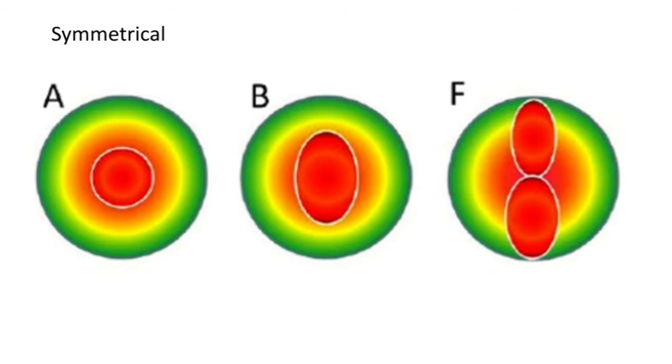So, when can you call this shape normal, and when does it become abnormal? By looking at the Kmax value. Suppose the Kmax value is more than 50 and it shows a normal round shape in the central area, it indicates there is a chance of keratoconus. Or if a symmetric bow tie is there but the Kmax value is more than 55, it is also an abnormal ectatic condition. So, you need to look at the thinnest location as well as the Kmax value to say whether the cornea is normal or abnormal.